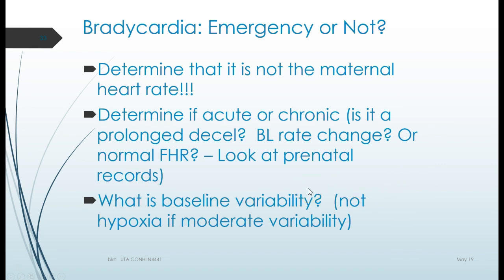We're going to determine if this is an acute or a chronic change. Has this baby been hanging out? Say that it's a 100. And yes, that's just a little bit below 110, but 110 is our cutoff. So anything less than that, if it's hanging out at less than that, that's a concern and has to be evaluated. It's not close enough. It's less than the 110, so we're going to evaluate it.